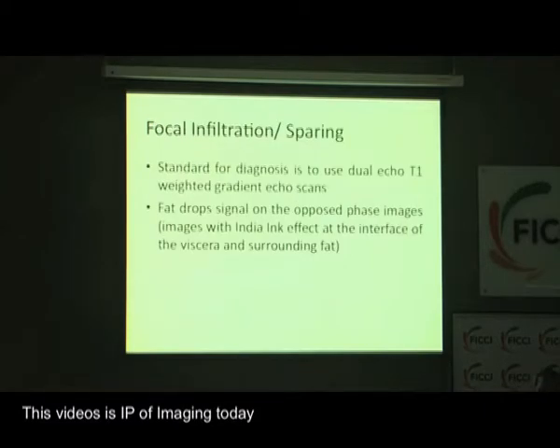Focal fatty infiltration and sparing are the commonest pseudo lesions that we all come across. And it's pretty simple to switch on and off with one sequence of MR, which is a dual echo T1 weighted gradient echo scan, where fat will drop signal on all opposed phase images.